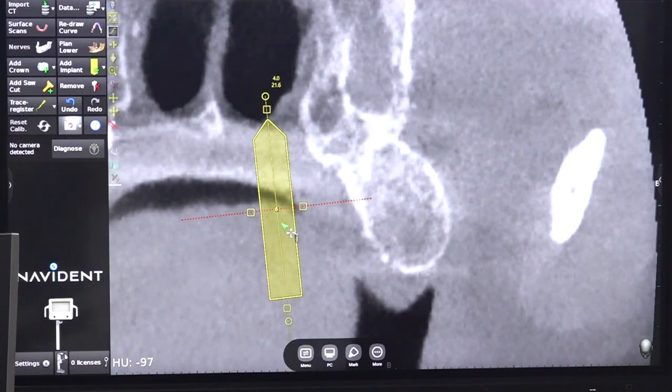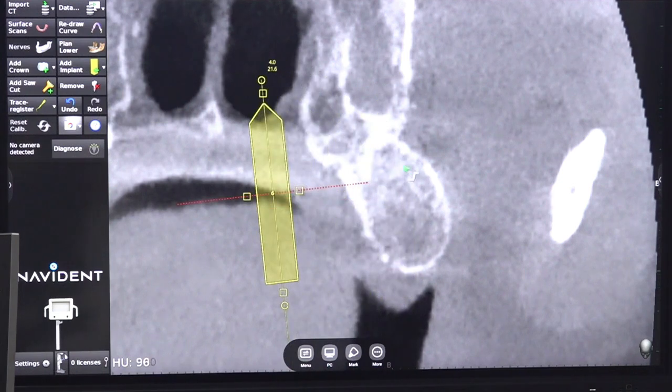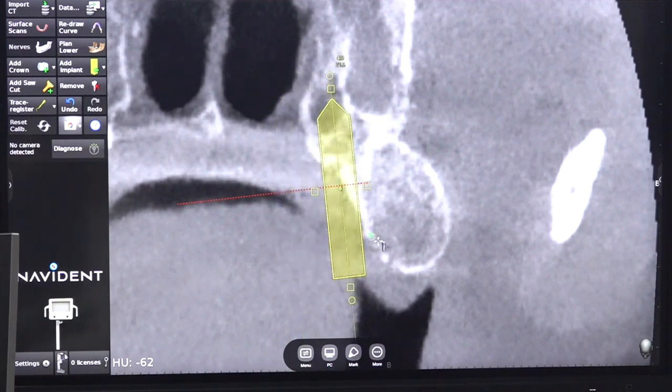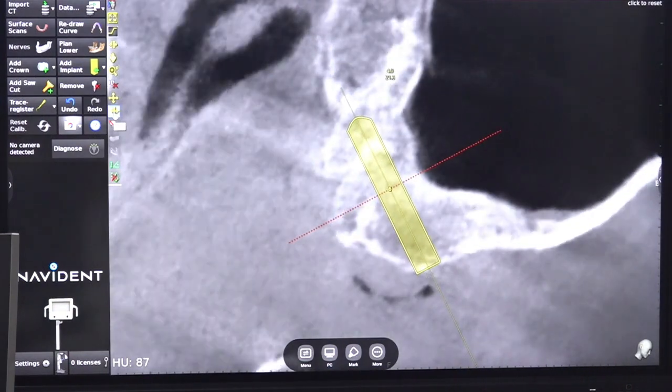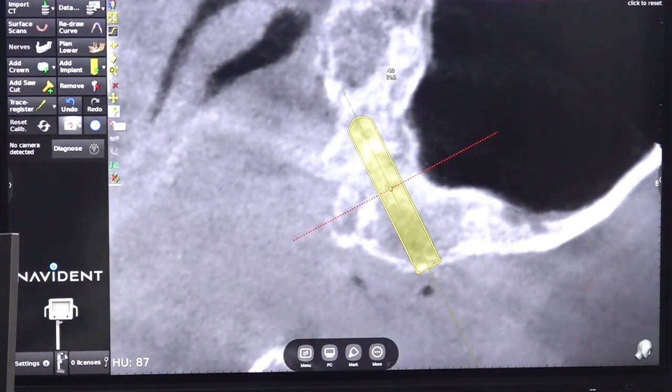Excuse me. So you can see the tuberosity is fully porous bone. Only here it is cortical bone. So tilt medially and target medial direction. We will see the 360 degree angle. Sorry.